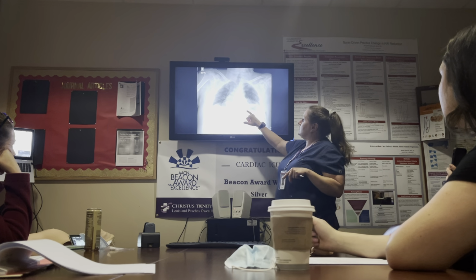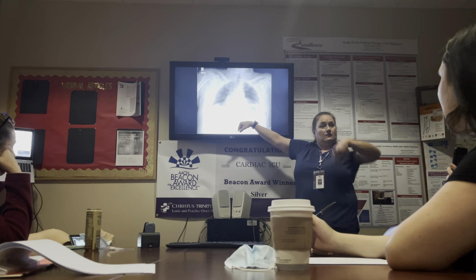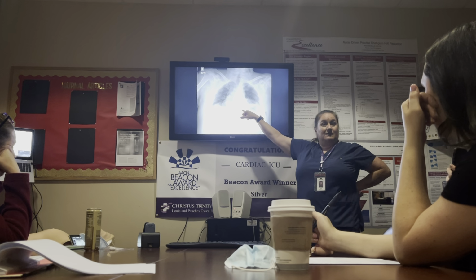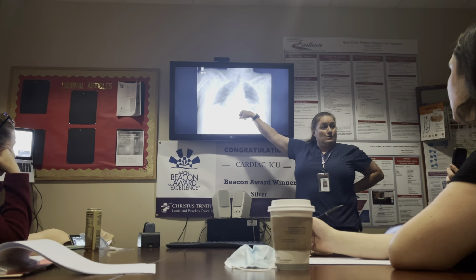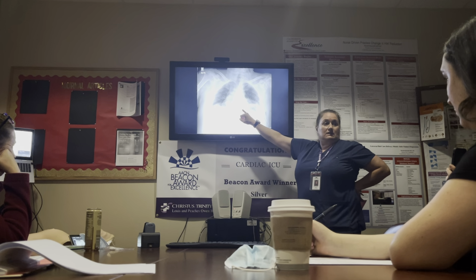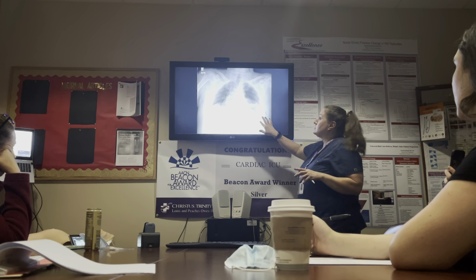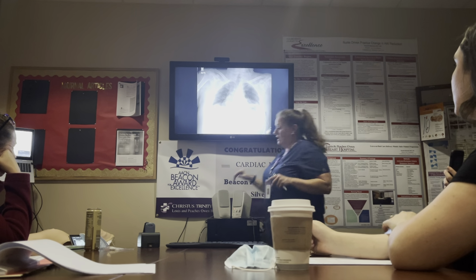So this chest tube goes in the back, down the gutter, back over here, but it's kinked, okay? So you're not getting the expansion or the removal of the air because you're kinking right at that eye hole, right at the side that should be in the chest anyway. But it's not effective, okay? So we would want to pull that chest tube back and let it re-expand and be able to help us re-expand that chest, okay? All right.